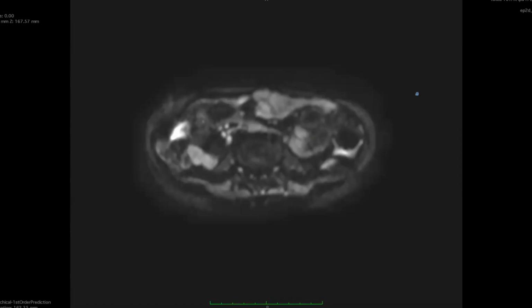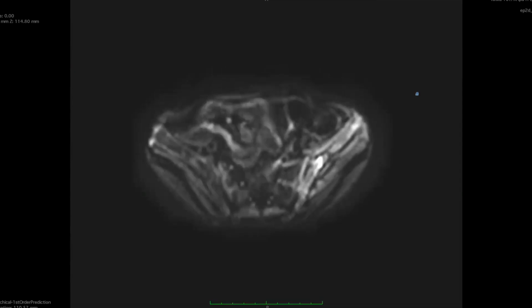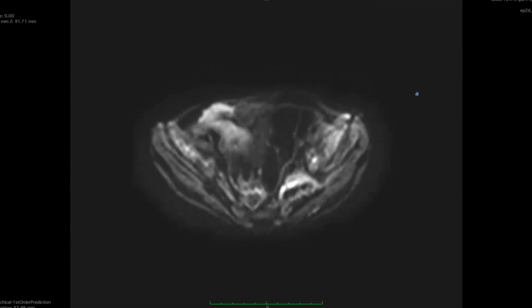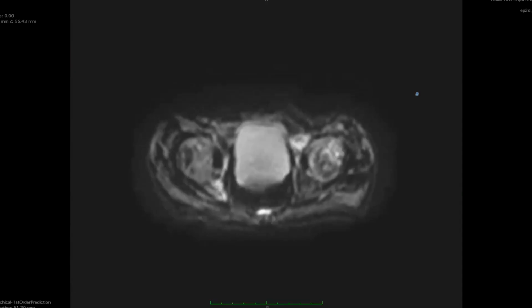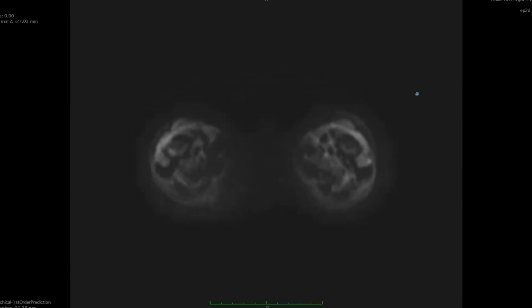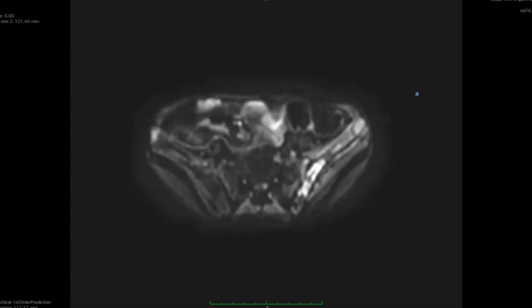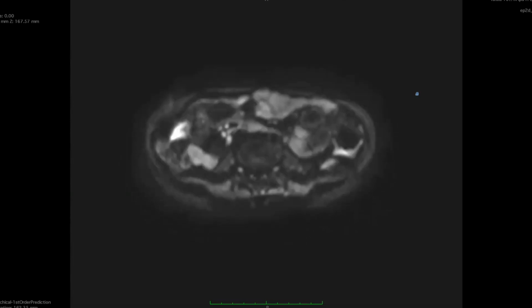This is a diffusion weighted sequence. On the diffusion weighted imaging, I can see high signal involving the visualized signal abnormalities in the previous sequences. Apart from that, there is no extra osseous abnormal diffusion signal seen. In my routine practice, to confirm true restricted diffusion, I would like to confirm it with the ADC maps also. Do you see high diffusion signal in all the bones or only specific areas?